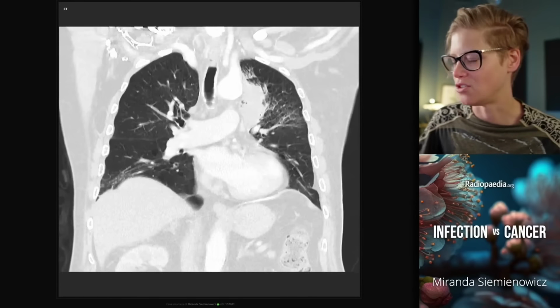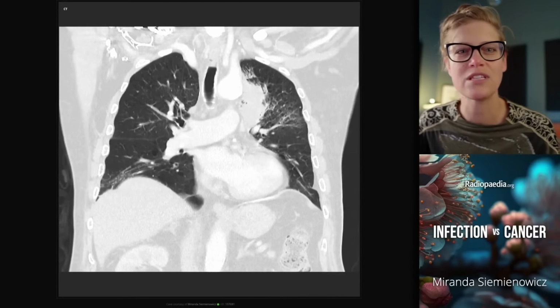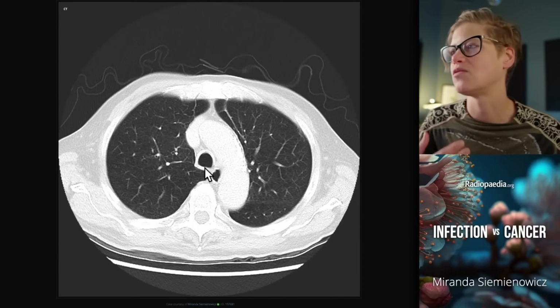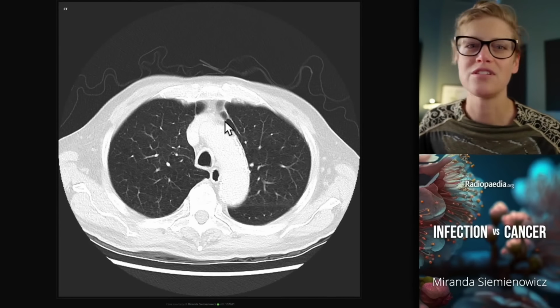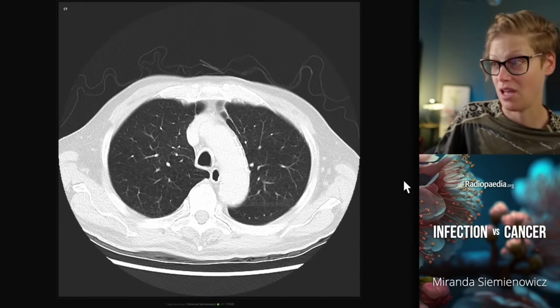This is a don't touch lesion. This is wait for 6 weeks, empirical treatment with antibiotics. And of course, when we image a few months later, there's almost no evidence of there ever having been any abnormality.